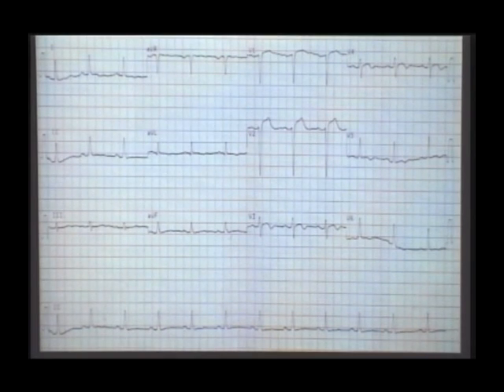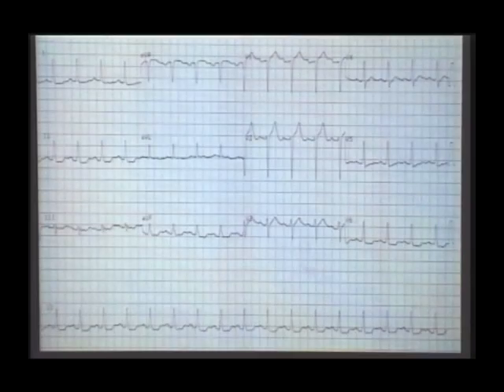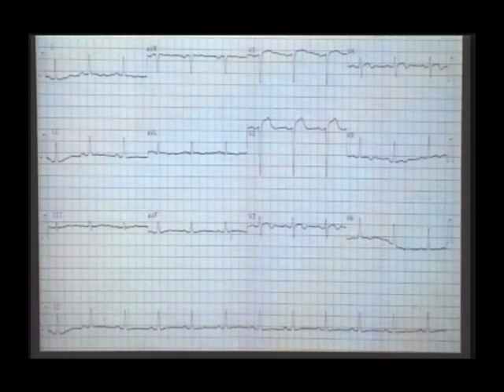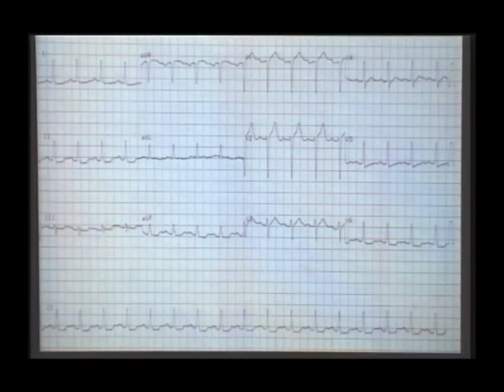You can see the next ECG of the patient after 1.5 hours. Such a huge ST elevation has come to this type of ECG where the R wave continues to be preserved in V1 to V6, L1 and aVL. So everything has been saved because of the early thrombolytic therapy. At the time of discharge, the patient has a near normal ECG. The fellow who came with this type of ECG can go with this type of ECG if you are able to intervene early.